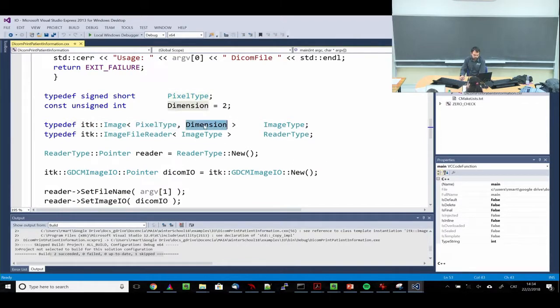Those two things are defined before in the previous lines. And we call this a kind of a new type, image type. You can call it whatever you want. Okay? This is not declaring a variable yet. It's just saying, I'm going to have some new type, like integer, chars, longs, etc. Now we're going to have image type.